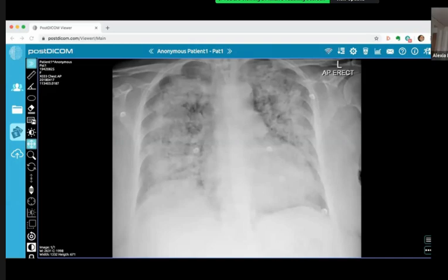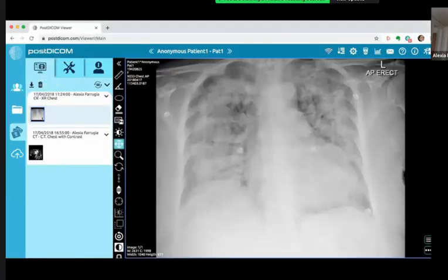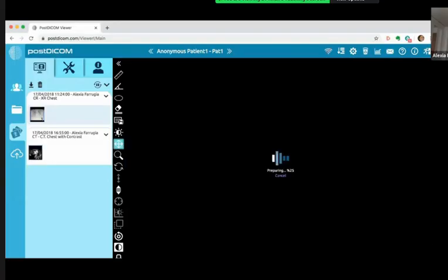So with lung infarcts, would you expect that peripheral sparing? Yeah, you can see that there's peripheral sparing here. So that would be quite unusual for pulmonary infarction. This is quite central, isn't it? Yeah. Okay, so I'll show you her CT. There's a CT just with contrast for her.